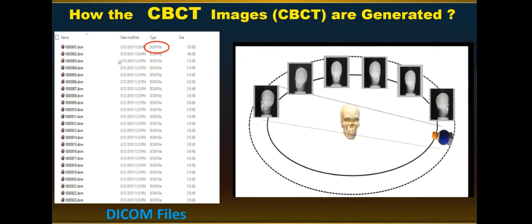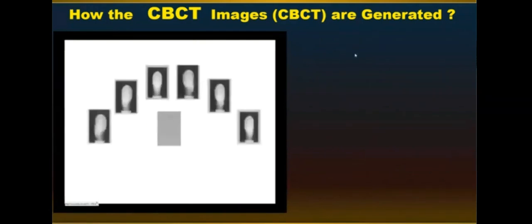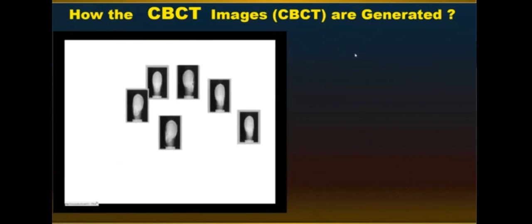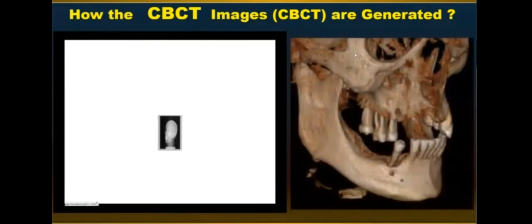So it's very important, when you use any software, to know where the DICOM data is. These DICOM data inside the software are collected, all of them together, like this, in order to form the CBCT data that we see displayed on the computer.